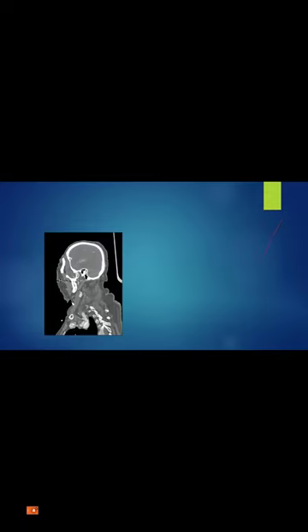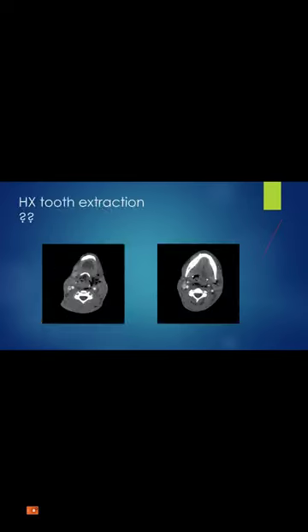And the best way to do that, if there is mild or minimal vasospasm, is to compare it to the most recent one. To do that, you need a thick slab here, a thick slab there, and pair them together just to get the best out of what you have.